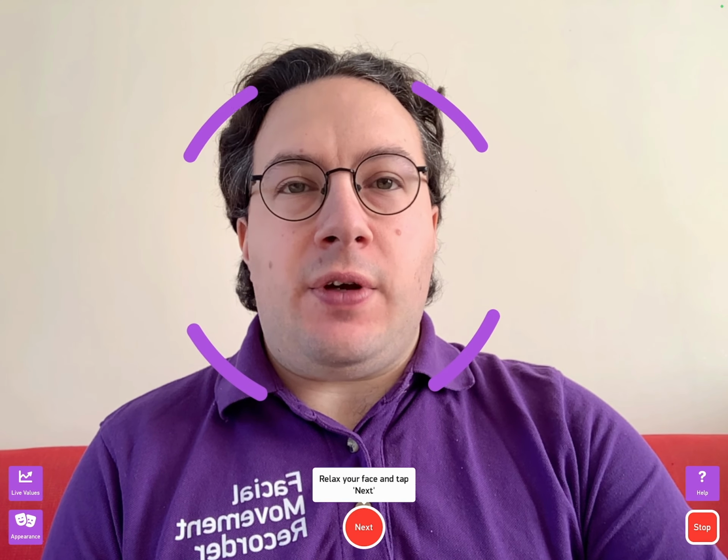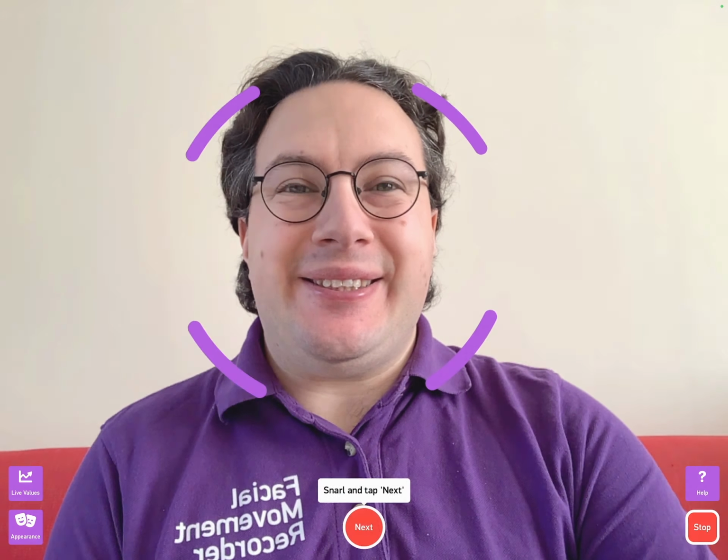So I'm going to press the start button now, and the first pose that I need to do is just relaxing my face. Then I need to wrinkle my forehead. Then I need to close my eyes gently. Smile with my mouth open. Snarl. And pucker my lips. That's it. That's my Sunnybrook poses recorded.